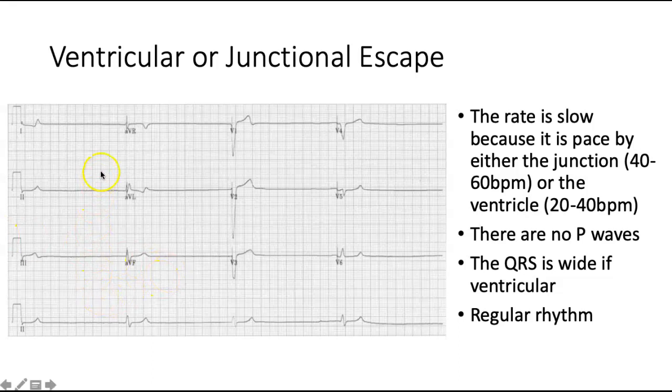If we look at this 12-lead EKG, we can't discern any P waves. There's a little blip there, but even if it is, it's very prolonged. But I can't see any other P waves. And the rate, if we count it out, is also quite slow. 300, 150, 100, 75, 60, 50, very slow.